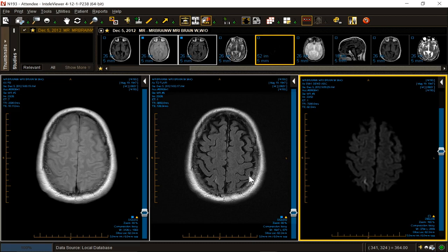Okay, so what are some considerations? The gait disturbance has been going on for about 9 months. I know this case. He's an older spine surgeon. So it's peripheral, right? It's cortical and subcortical. So what about an infarction?